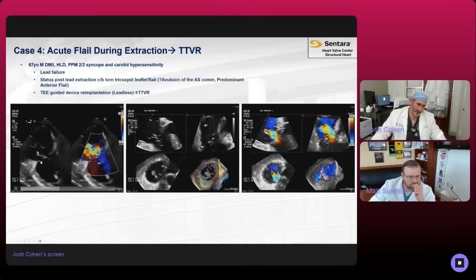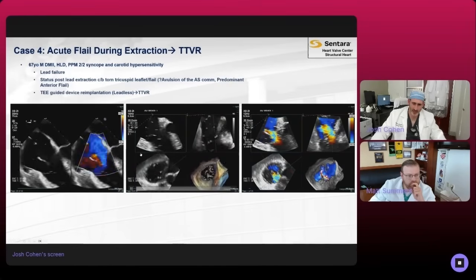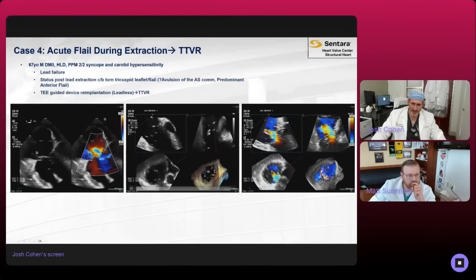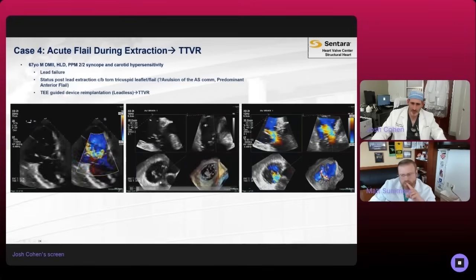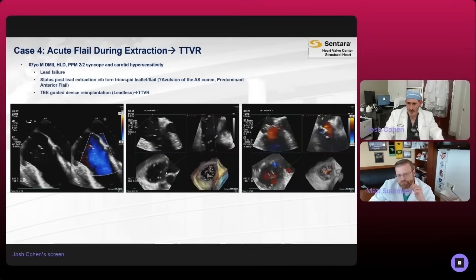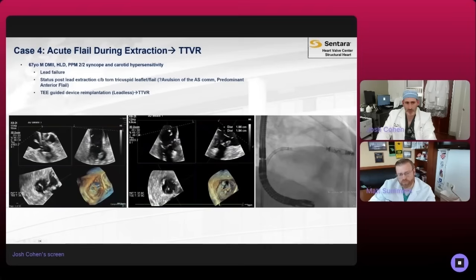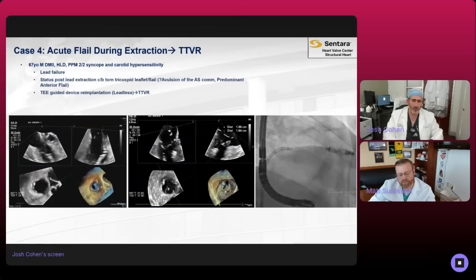You see this flail leaflet. There may very well be part of a pat muscle on there. There's a significant Chiari network here as well. And I don't think we totally appreciated the extent of that TR. You go into MPR, you see it's really involving maybe the AS commissure, certainly this anterior portion of the anterior leaflet. And then you see that jet is fairly broad in origin, and really originates exactly where that pathology is.